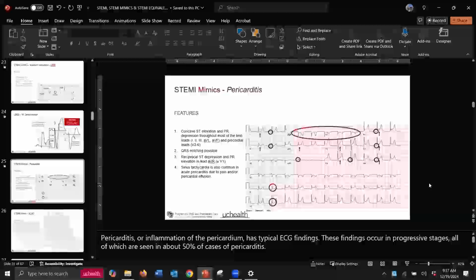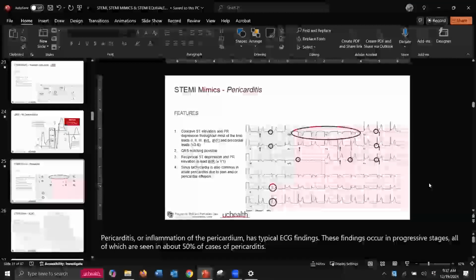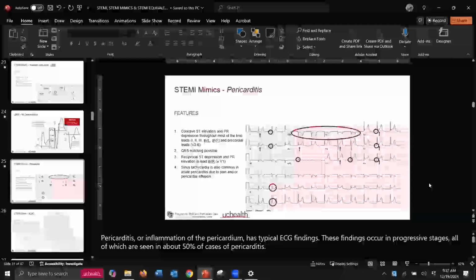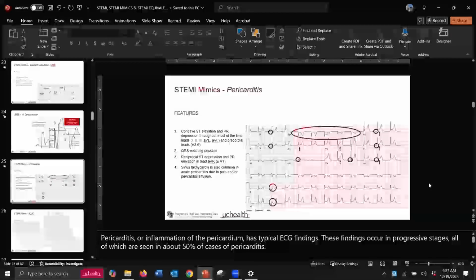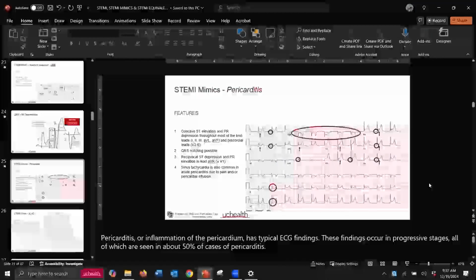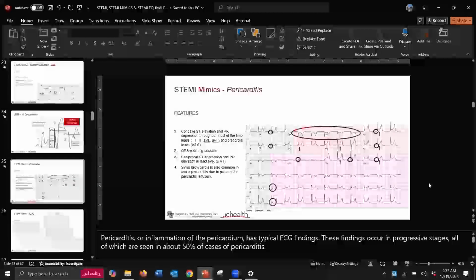I don't feel really poorly about alerting this at some point because it's still a sick heart. We may have a pericardial effusion that goes along with this, clinically or subclinically, right? It may or may not be affecting our heart. It may or may not be tamponading the heart in some form or fashion.